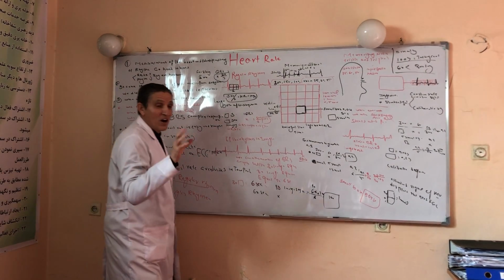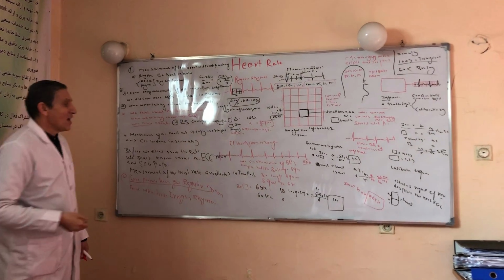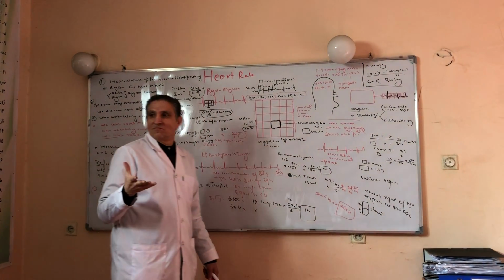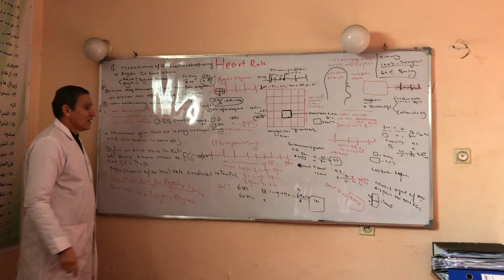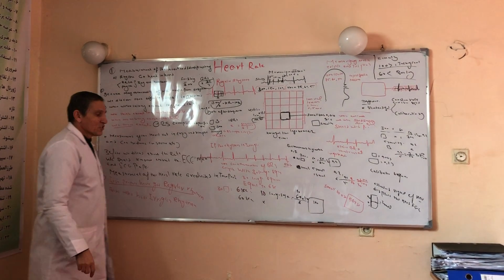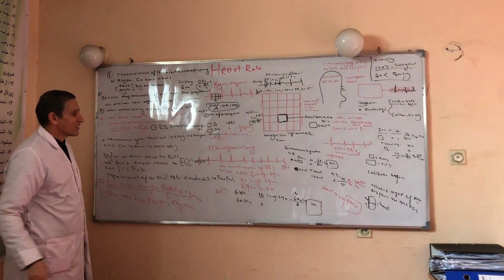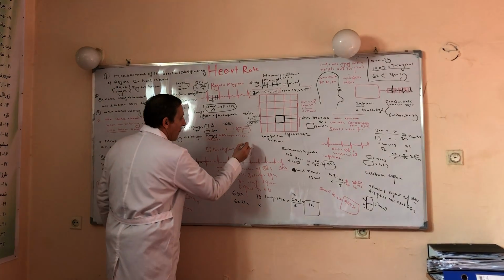It is easy. If the heart rhythm is irregular, for example, a patient has atrial fibrillation, how should I determine the heart rate of those people who have an abnormal rhythm? For example, this patient has atrial fibrillation. The RR distance is not equal. So in such cases, we count the number of QRS complexes within 30 large squares.